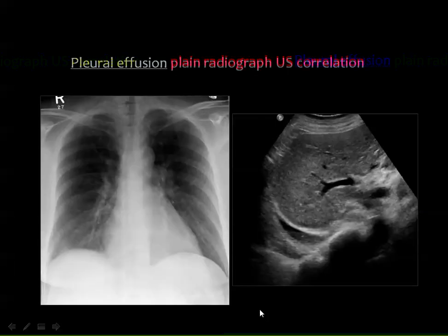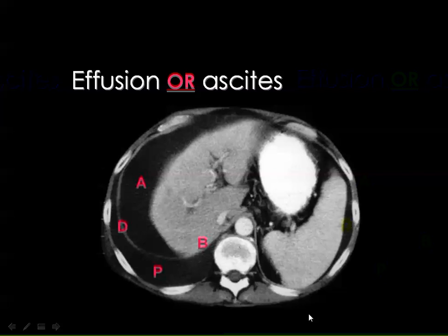more commonly the ultrasound. And here the chest X-ray shows almost no evidence of effusion except for minor blunting of this costophrenic angle. But by the ultrasound you can detect very subtle pleural collections as well as the collections inside the abdomen if they coexist.